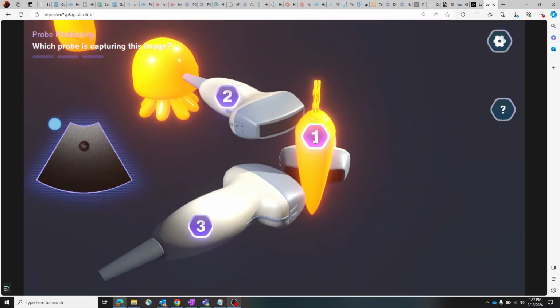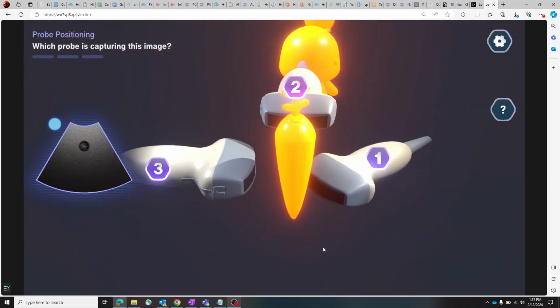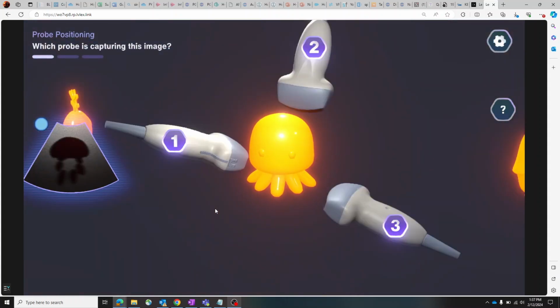In fact, all of this is automatically built in. Any session that you're currently playing, you get the score, and there's a back end with automatic data collection.